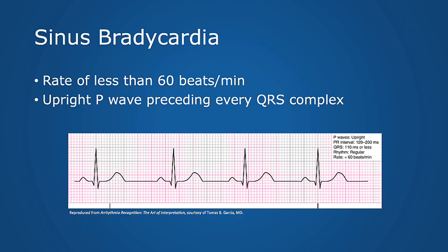So, I found a file with a bunch of old strips in them. Like the dates on some of them are late 80s, early 90s. The heart hasn't changed. But I put a lot of these strips in here just so that y'all could see something that's not just computer generated. Because this right here, this is a beautiful sinus bradycardia. Like it's like this person read the textbook and made their heart follow what the textbook says, right? This is computer generated, and that's what you see a lot in your books and all of that.